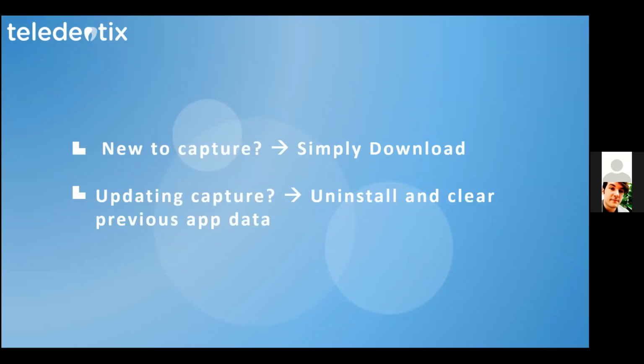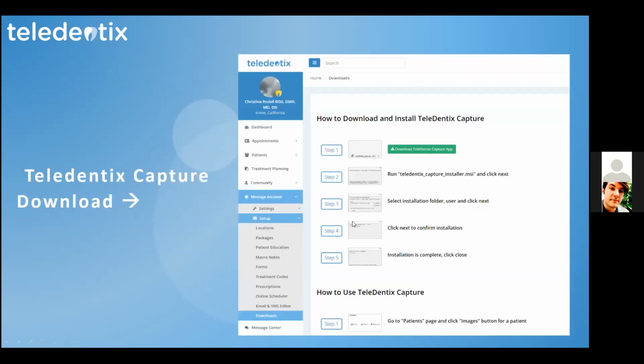And we're going to walk through that as well. And the reason why we're not doing just a simple upgrade is because there are so many features and a lot of new implemented logic that went into this capture that was previously non-existent. So it really requires an entire swipe and start from fresh, okay? All right, so now here, this is how you download Teledentix Capture.